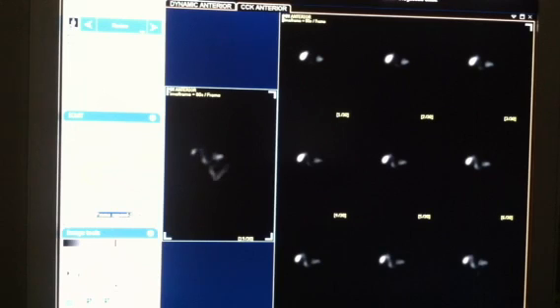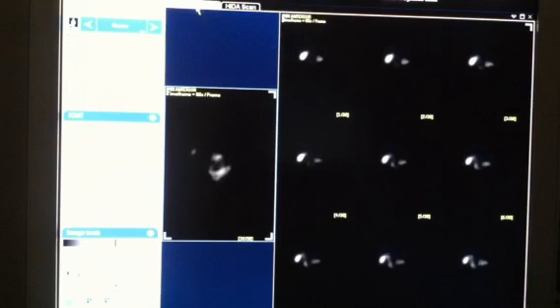And this is our result. We're going to change this, and we're going to call it Hida Scan. And we click on this icon here, and that creates our new file. So these 2 files I'm just going to get rid of. I'm going to hide this one, and I'm going to hide this one, and I'm left with this one file now. So what I'm going to do is I'm going to come back here, and I'm going to come back to our Viewer Tools, because we're still going to use this.